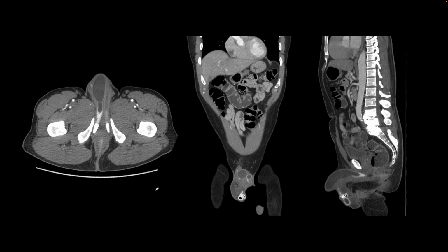All right, next patient had a penile prosthesis. We see the cylinder on the right side and the cylinder on the left side. So proximally they look symmetric, but distally there is an aneurysmal dilatation of the cylinder, and this is one of the complications of penile prosthesis.